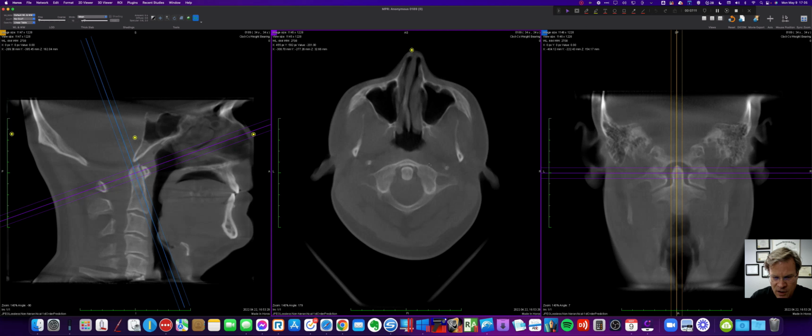What we're trying to find is the long axis of this. Now, that's important for two reasons. Number one, we want to look straight down that long axis so that we can see this outside edge right out here. And we can look at that outside edge along that angle, and we can see if the atlas and the skull are lined up. If we're here, we're looking at the back because we're coming straight in from the back. So you see this yellow line, we're coming straight in here. This person has a fairly straight line back here, but the back is not the best place to see. The mirror image usually occurs anterolateral aspect right in here. So if I saw a misalignment here, I would just ignore it.